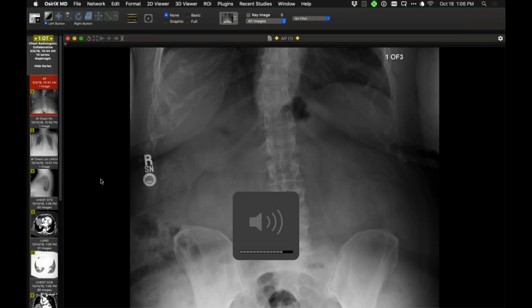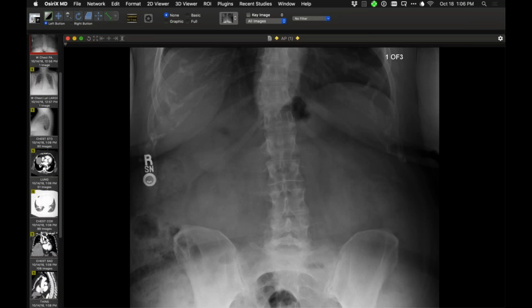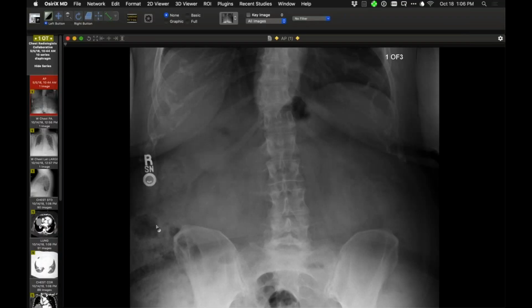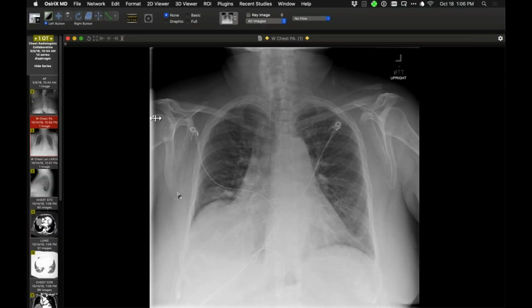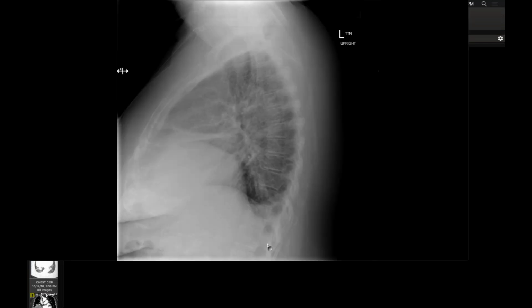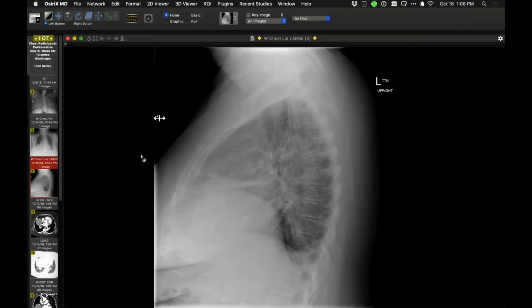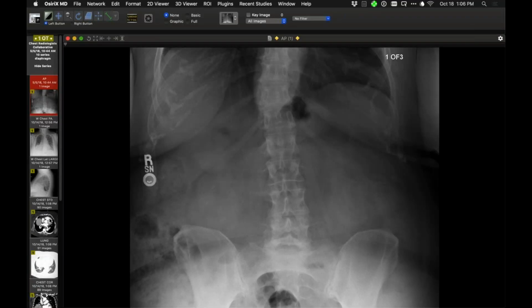I'm here. Great. Okay. This is a really nice case of diaphragm eventration. I hope you'll agree with me. So here is a radiograph that is a recent one. When we look at the pattern of elevation of the right hemidiaphragm, it involves a good portion of the anterior diaphragm, but the posterior diaphragm is in the normal location compared to the other side. And going back to May of this year, this being October, we can see that it isn't new in relation to the anterior diaphragm from then.